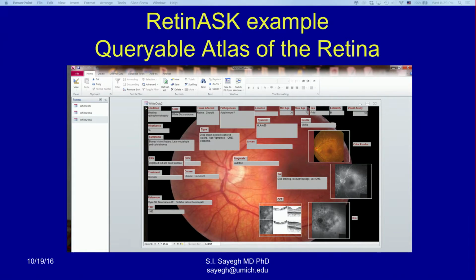So let's say like a 36-year-old woman walks in the clinic and complains that her left eye sees much worse than 2 weeks ago, and it was a gradual onset. So you have several elements that you can put in here with filters. She's not 2 years old. She's not 80 years old. It's a she. It's one eye that's affected, and so on and so forth. If you put this in, it's going to filter all of the other things that don't apply, and it will come up with a short, hopefully short, diagnosis or list of possible diagnoses, and it will pull that.